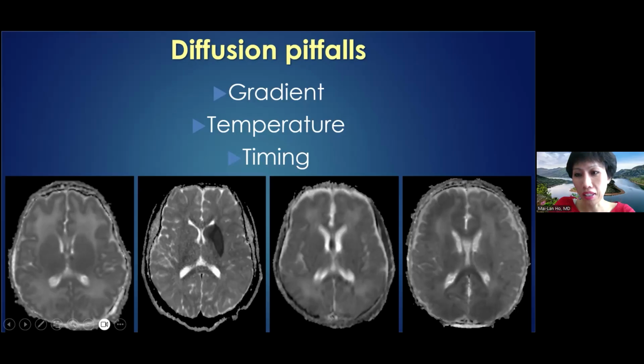And then these areas again, if it's a severe insult, moderate or severe, you have ongoing injury at day 5 to 7. That's pretty bad, right? Because normally the diffusion signal comes down and starts to pseudonormalize after 4 days. So if you're still seeing diffusion restriction, even if it's only a little spot, the fact that you're seeing it later on means you're probably dealing with a more serious insult, if that makes sense.